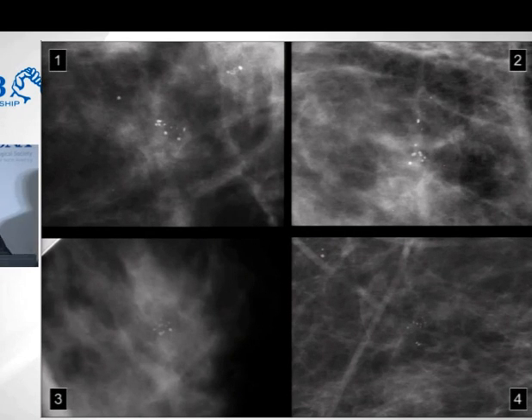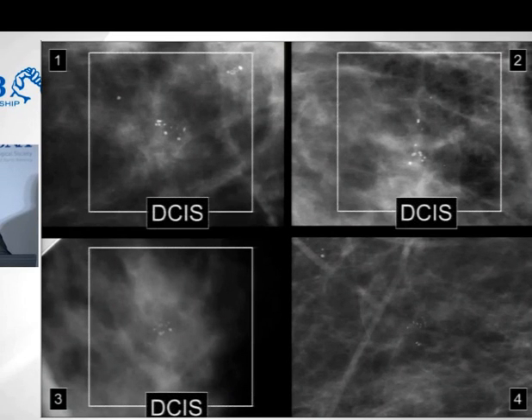There's no keypad. This is just in your own mind. Pick the one that you think is different than the other 3. Take a moment to look at them. Which one is different? Each of these was new or increasing. There you go. It was number 4 that was different, but not the way you think.